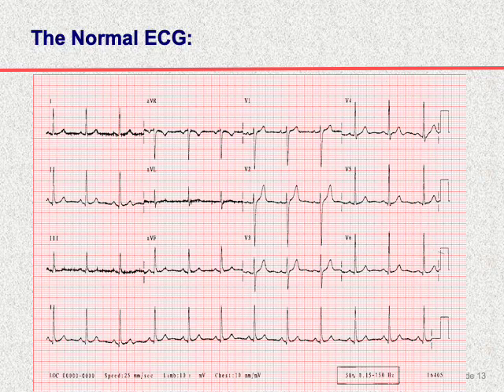So this is a normal P wave upright in 1 and 2, and also a normal PR interval, which is constant, and each P wave is followed by an R wave. So this is sinus rhythm. We look at the rate and regularity here, so this is normal sinus rhythm. So this is very easy. Why sinus rhythm?